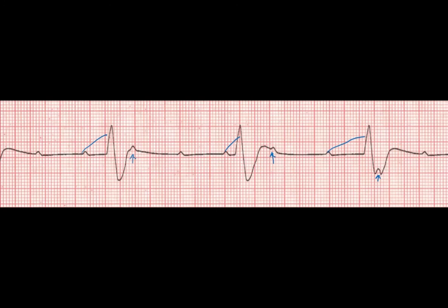Now let's reverse it. Are there QRSs for every P? Well, let's see if this yellow one will work. So there's a Q, here's a P, it's missing a QRS. There's a P, oops, there's a P right here. We're missing a QRS. We're missing a QRS here. We are missing a QRS complex here. Another QRS complex is missing here. And another one is missing here.